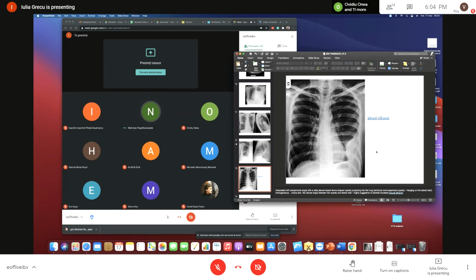Thank you. Okay. So the basic things that we can do are a posterior anterior film, a lateral film, and a supine film, or a film performed with the patient laying on his back, in order to determine most of the information that we need to know.